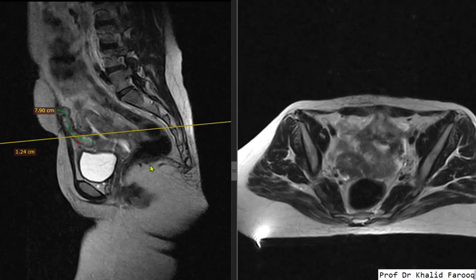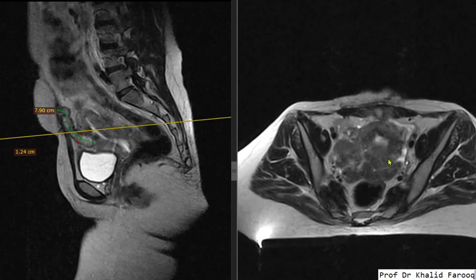Usually we see fistulous communication between urinary bladder and uterine cavity, and we can also see fistulous communication between uterine cavity and adjacent gut tubes. But here we see this is a fistulous tract between uterus and anterior abdominal wall.